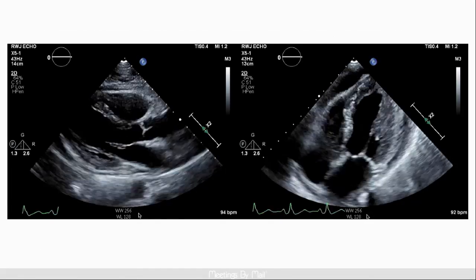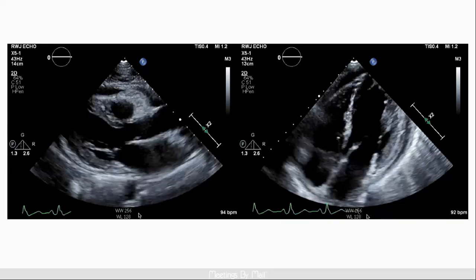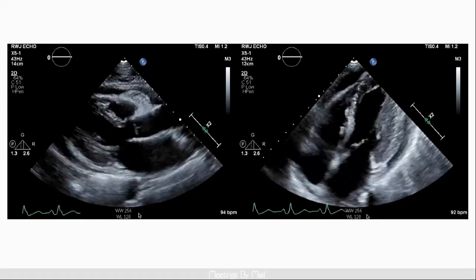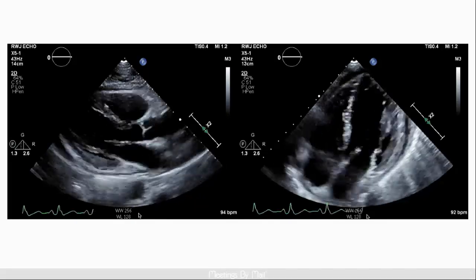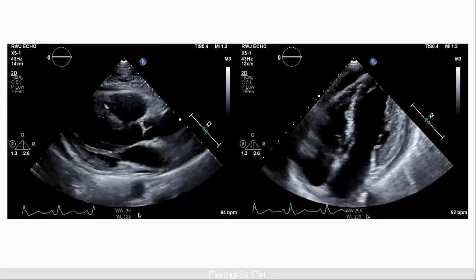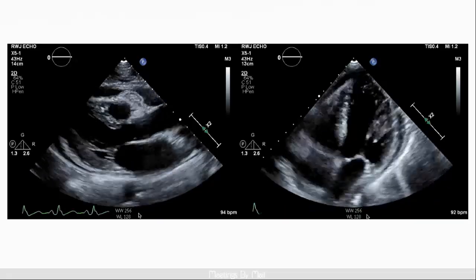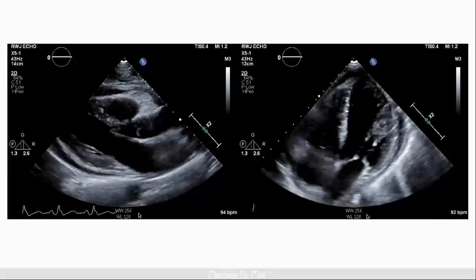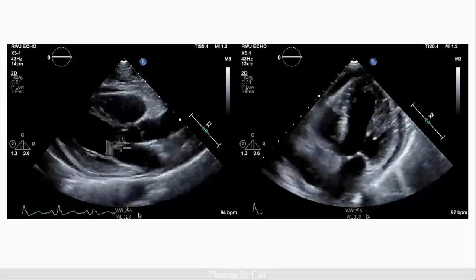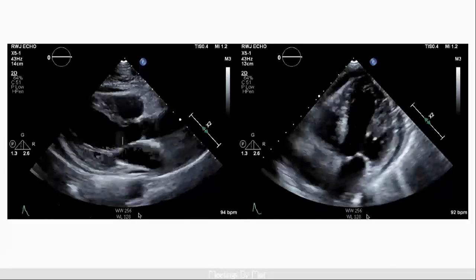So if you see the images now, what you realize is that you're dealing with a very complicated course where there is also a likelihood of not just peritoneal or pleural spread, but also pericardial spread. You have the left ventricle, right ventricle, and you're asked to give an assessment: besides the pericardial effusion, what do we think and what should we do about it?